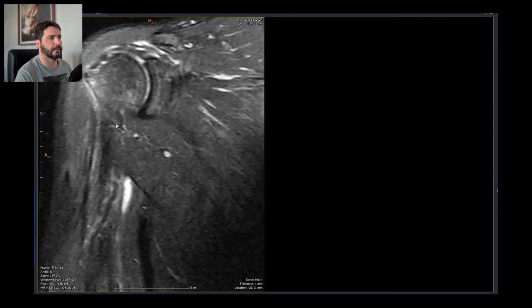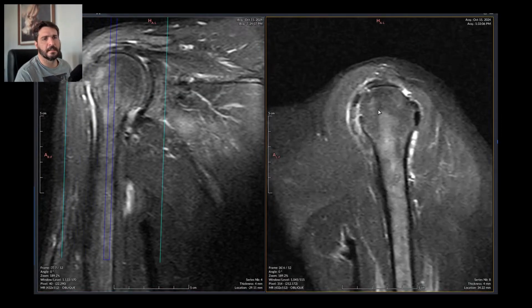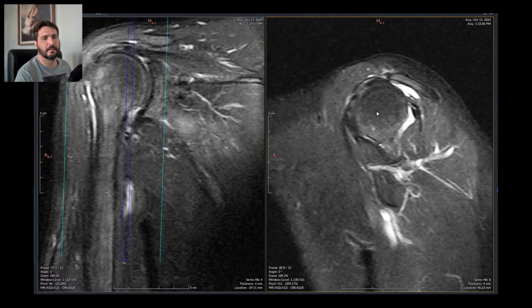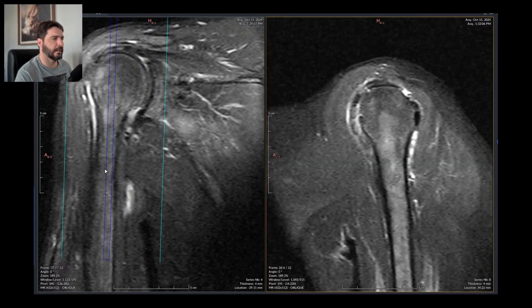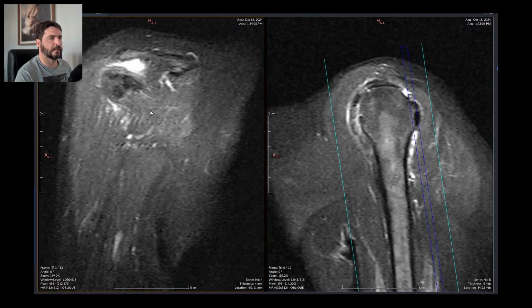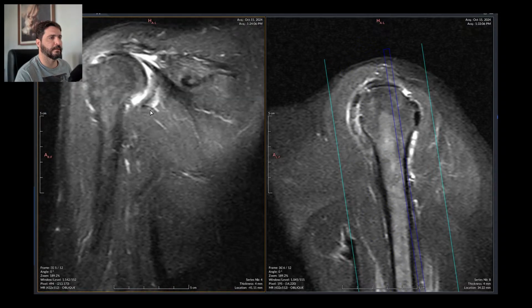So the rupture, the tear is less prominent. Is there any tear? Doesn't seem so. So this is even worse scan than the other side. I can't really tell. They did manage to make a worse scan this time than the other. So the left side is even worse.